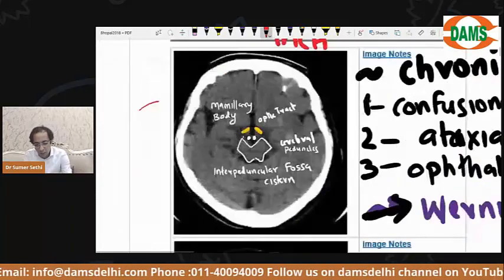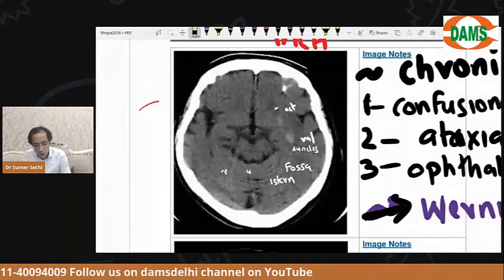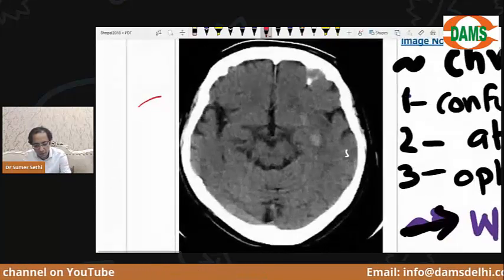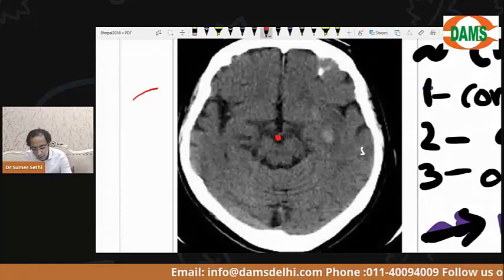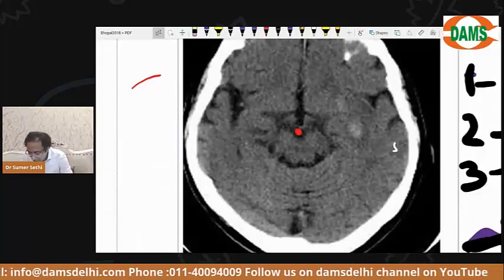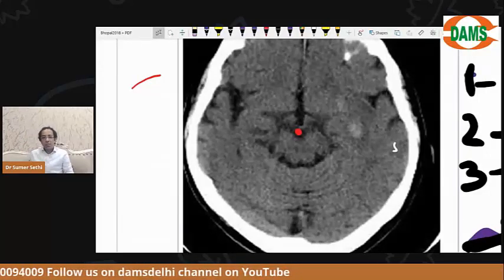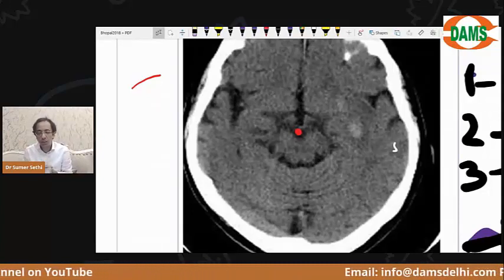Do you want to solve an AIIMS level question? Do you want to solve a top level question now that you've understood a little bit of anatomy? Let's go further. This is where you have the top of the basilar artery. So basilar artery, but listen to me, everybody, wake up, listen to me.